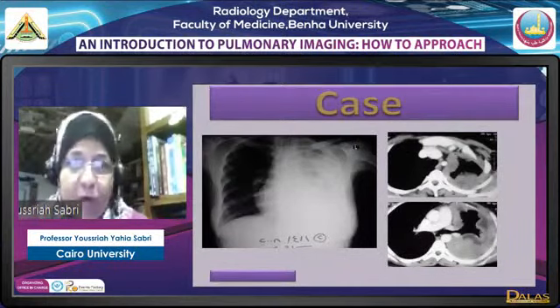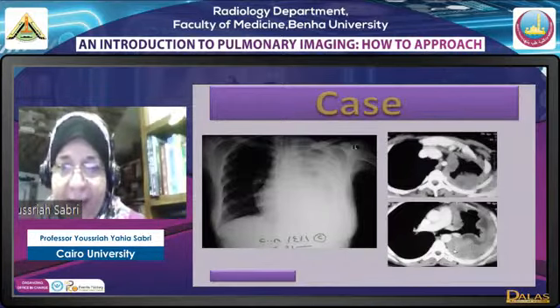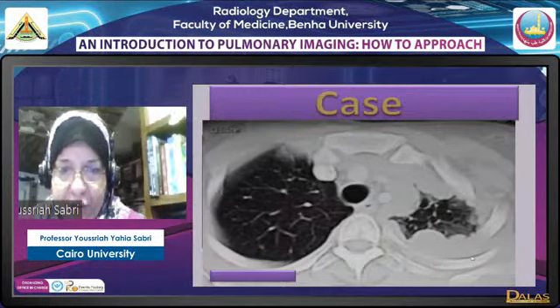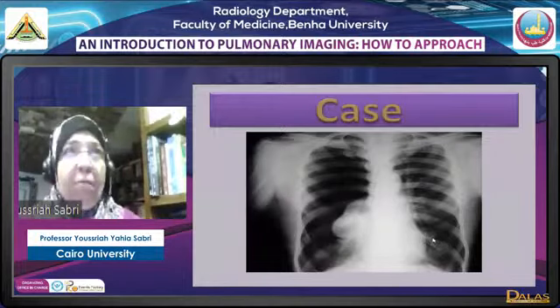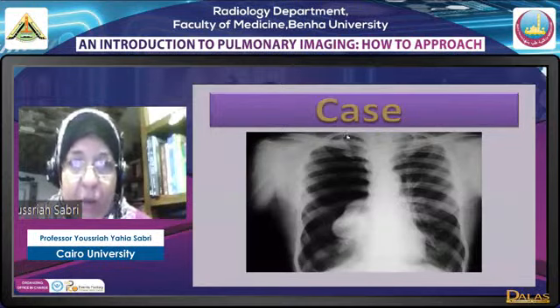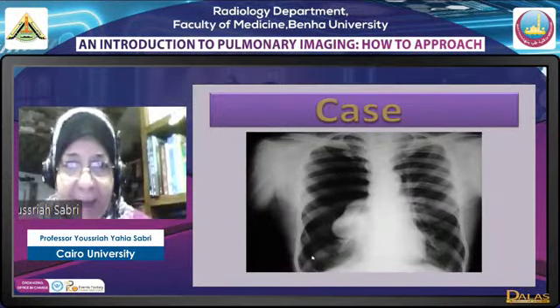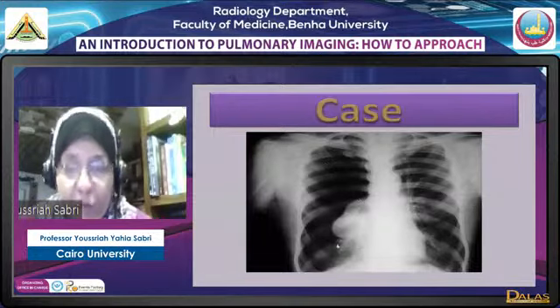Here we have an opaque hemithorax. In axial images, we have the nodular circumferential thickening of the pleura, classic for mesothelioma, giving again in the plain film an opaque hemithorax. Now shifting from opaque to black hyperlucent hemithoraces, we have this classic appearance of jet black right lung with right hemithorax, sorry, with a total collapse.